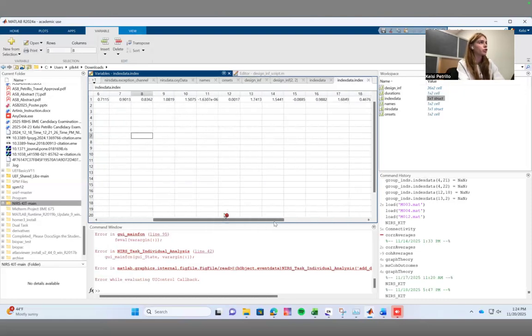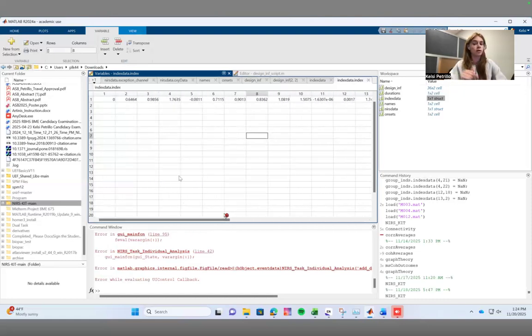Depending on what kind of analysis you're doing with the data, for the most part you're going to want to do a group level investigation of these beta values. Within my own data set, I have a couple of different groups that I've defined to stratify my participants.